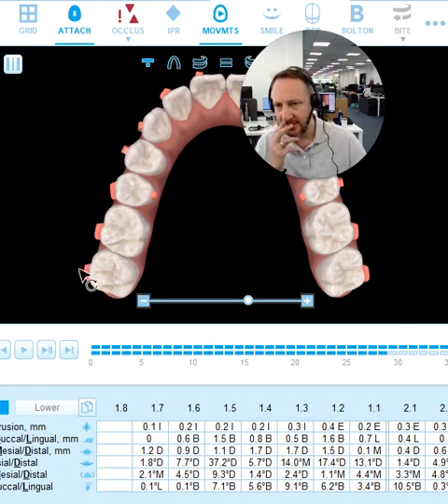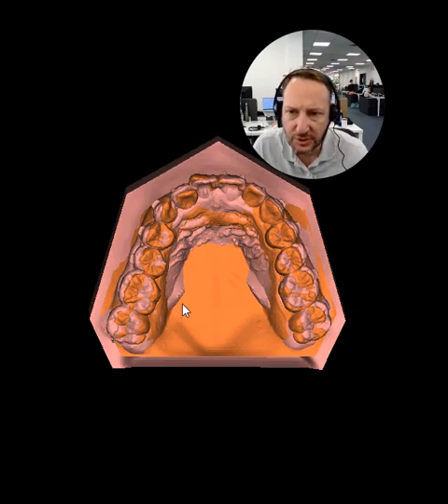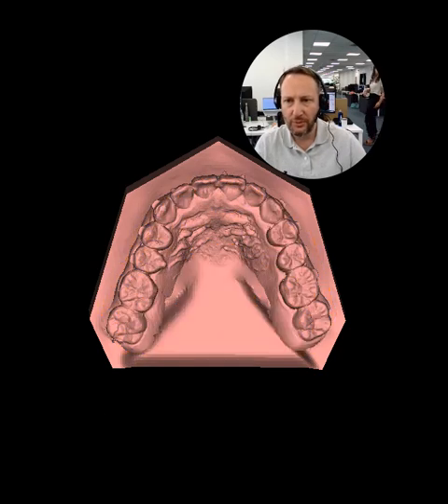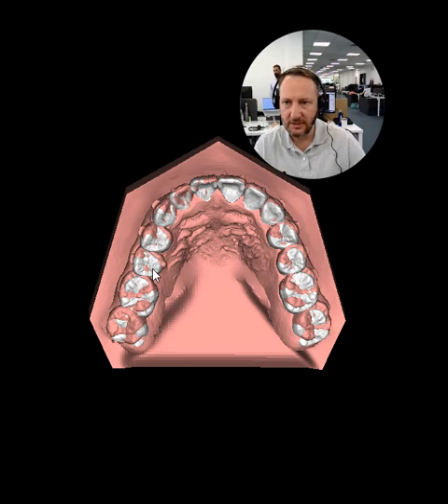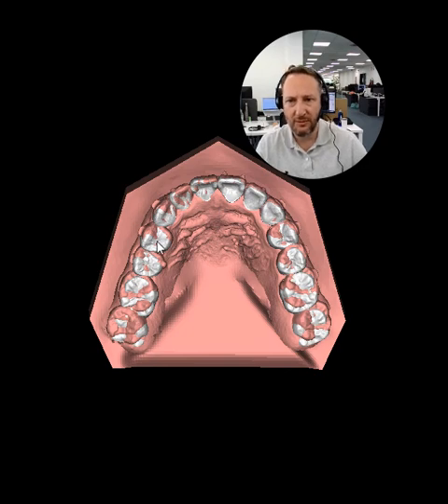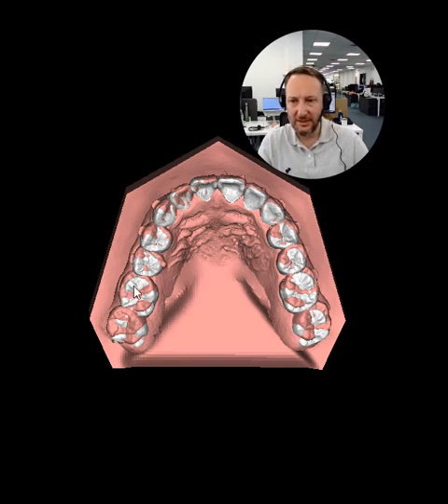After we finish this set of aligners and get to our quality control, where you can compare with the actual situation, this is the outcome so far. Bringing initial and final into this comparison, we could achieve a good correction of the rotation using these strategies. Considering the ideal final position, we still need to distalize a little bit more, as we can see here, but now this is a much simpler movement. We are going to finish this case with the anteriors already in a good position. This is just fine tuning with another refinement, and this case is done.